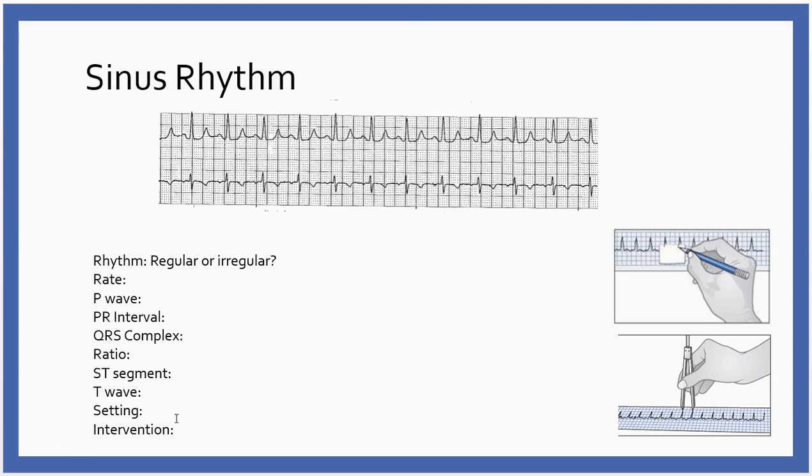In general, it's a sinus rhythm, and so that piece of it is considered normal. I do have some abnormalities potentially in terms of the T wave and the ST, and this rhythm really doesn't look the way it should. It could be because of the way the energy is passing through the heart. It could also be placement of electrodes, so I would have to investigate that.